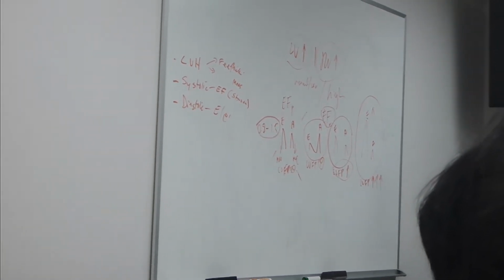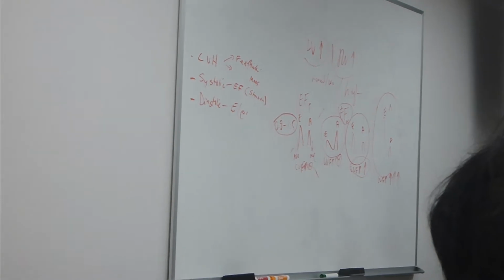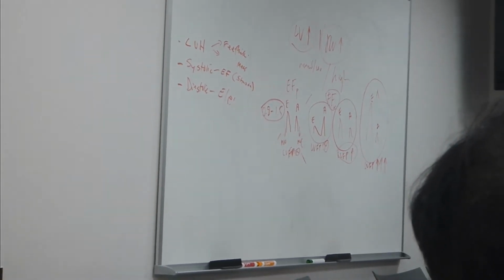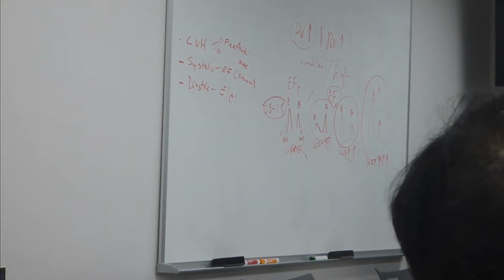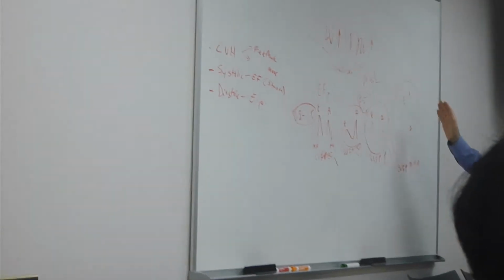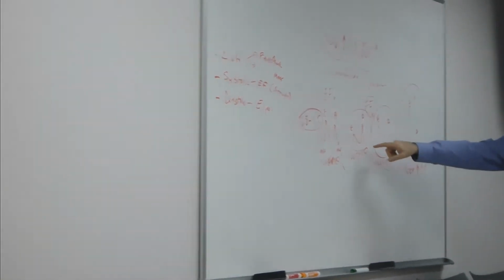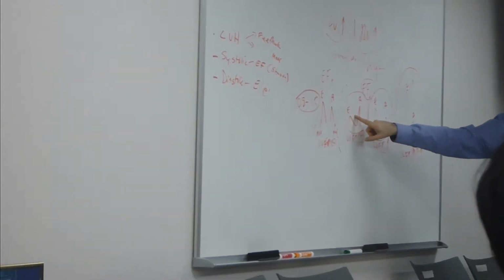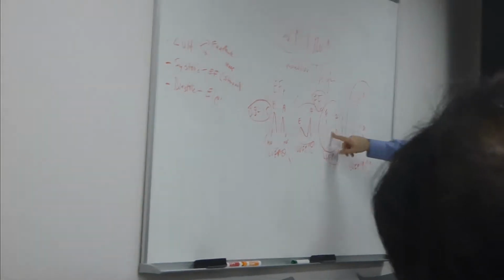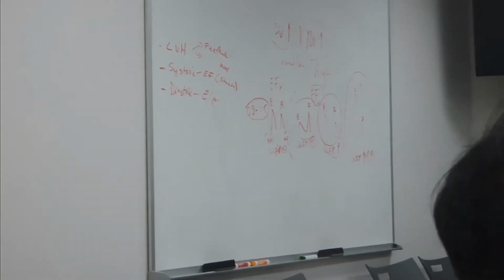So if you have reduced EF, this part is easy. You don't need tissue Dopplers because tissue Doppler is going to be low. EF is low, tissue Dopplers are low. All you need to do is look at the mitral inflow, and in most cases you can tell if the filling pressures are high or not. If they have this type of mitral inflow pattern, you're reassured the filling pressures are probably okay. If they have either pseudo-normal or especially restricted, you definitely know that the filling pressures are high.